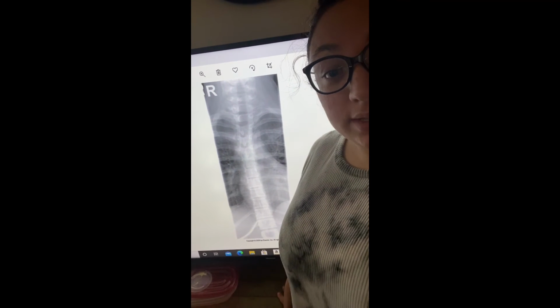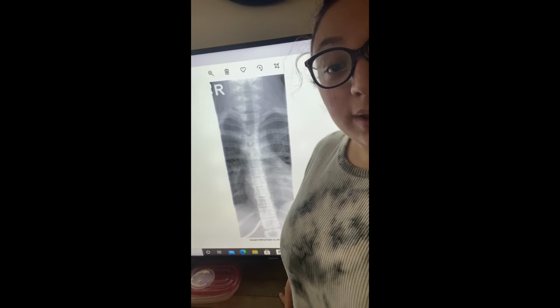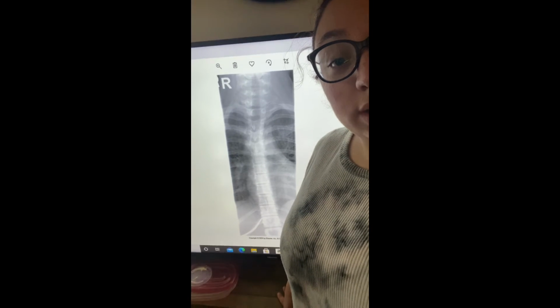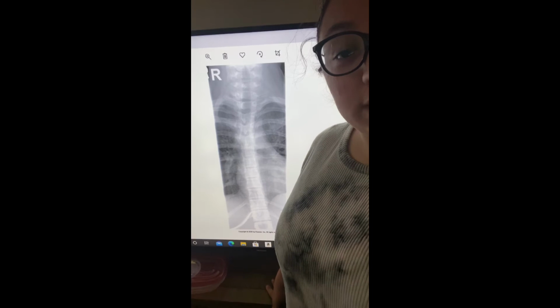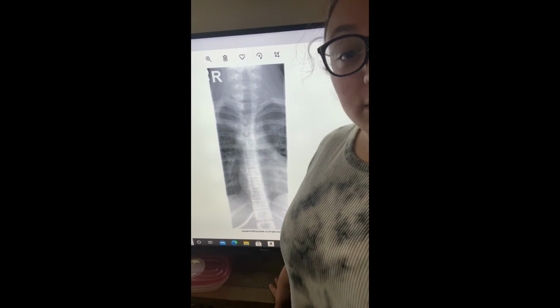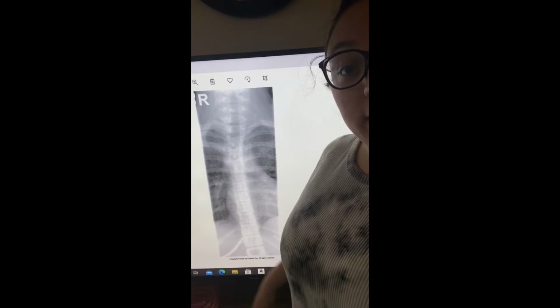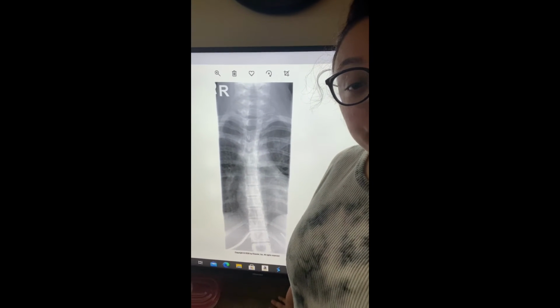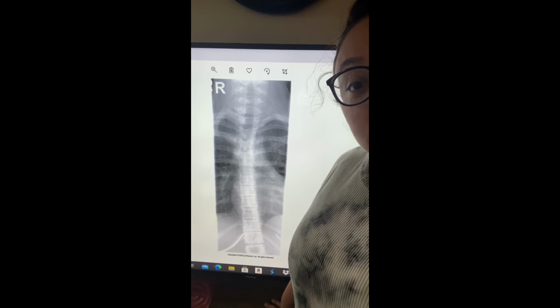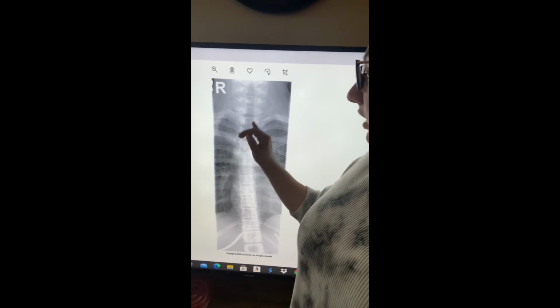Also, you can see that the lungs are pretty well exposed because you can see the lung markings, and the lungs should be pretty black when you're looking at this T-spine, and the T-spine itself should be very white and show good brightness. So let's go to brightness. I don't think this has good brightness because once again, up here it's okay.